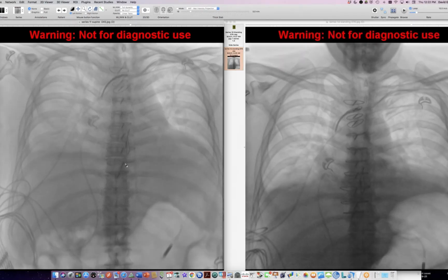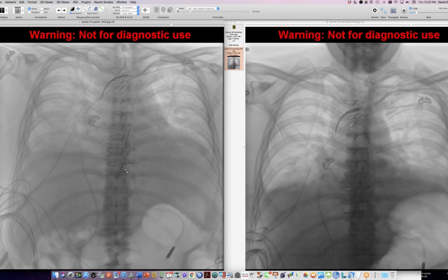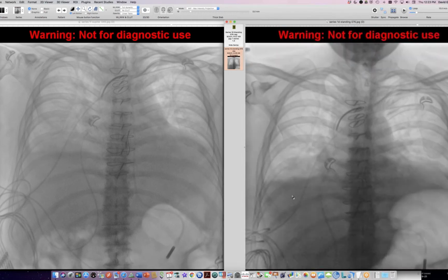Here we defeat that by having the person supine. This guy got very dyspneic when he was supine, and he has a paralyzed hemidiaphragm bilaterally. So it's very important, especially when there is the question of bilateral paralysis, to include supine views and not rely on upright views. Yeah, I have come close to missing this. As a matter of fact, I did miss it in the early days.